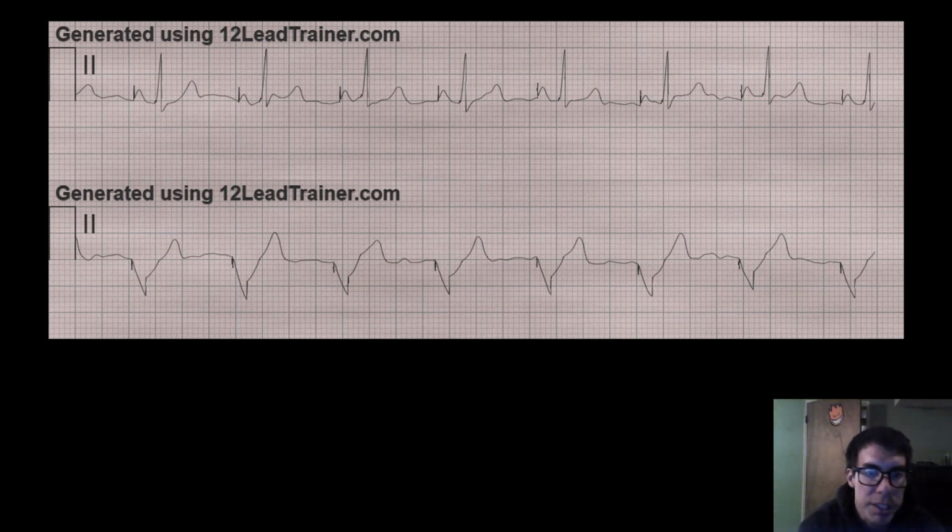And the bottom one is a ventricular pacer, and with ventricular pacers you'll have a wide complex after it, so that's why the QRS is so wide. So don't be surprised by that. That's how it will just be. But if you notice, I don't really see any P waves in that. Maybe some. Maybe there might be a P wave. But either way, it doesn't matter. Point is, that's clearly a QRS complex, and there's the pacer mark right before it. On the second one, it's right there. Third one right there. So that tells us that this is a ventricular pacer.